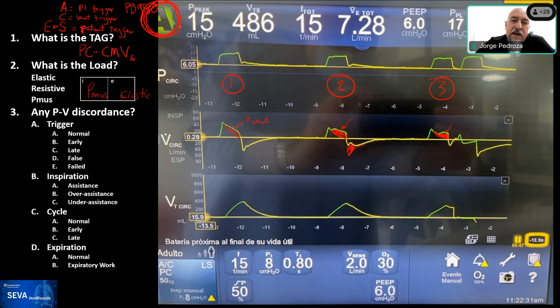I had to do a pause, a screenshot, and the ventilator is still working behind the screenshot, so this A is not necessarily related. If you rely on that letter, you should be watching each one of the curves.